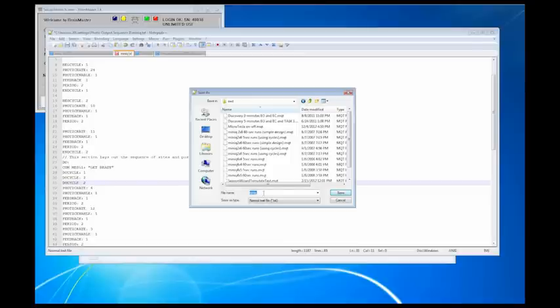And what I will do is I will name this Photic Wizard-BMR for BrainMaster. Now, if I save it right now, it's going to save as a TXT file or a text file. If you save it right off the bat as a TXT file, you will not be able to use it in the SessionWizard. The SessionWizard is designed to pull off the .mqt, also known as a mini-q template. So in order to save it, make sure you type in .mqt.